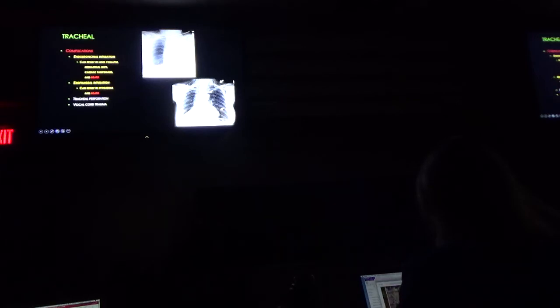All right, so again, confirmation for placement, and then obviously you're checking all of your line markings for any abnormalities. This patient's definitely got some atelectasis going on there. And this lung field is going across midline, so we've got a tension pneumo started. Obviously, we're decompressing it on this side. So, right main stem, pull back.